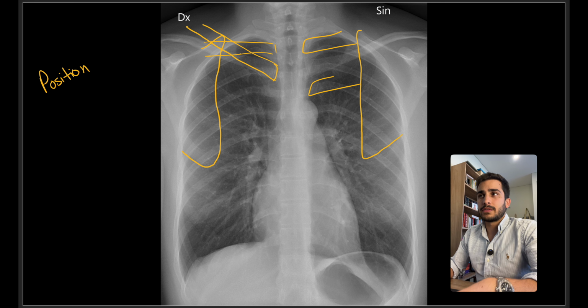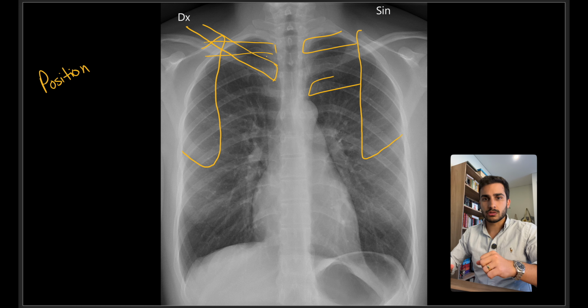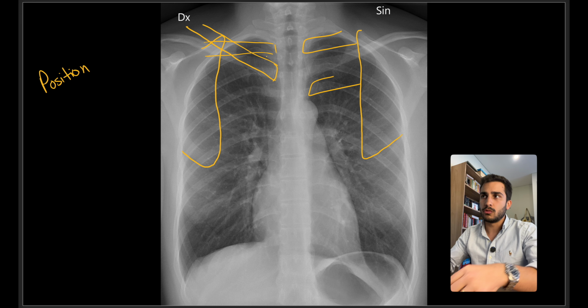And generally, if the medial end isn't really too high or low, and it's just the whole clavicle itself is angled quite a bit, that generally is indicating that the patient's shoulder was just really high when they were positioned, okay? So if the patient's shoulder is really high and they roll their shoulders forward, or just high in general, that makes the clavicles angled a lot more than they otherwise would be. Okay, so that was the position.